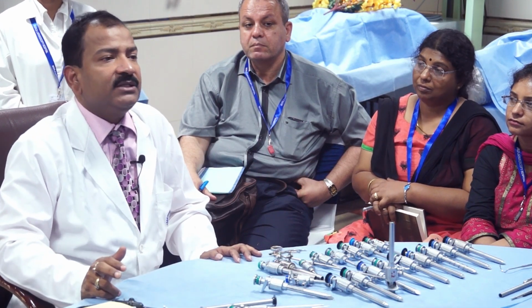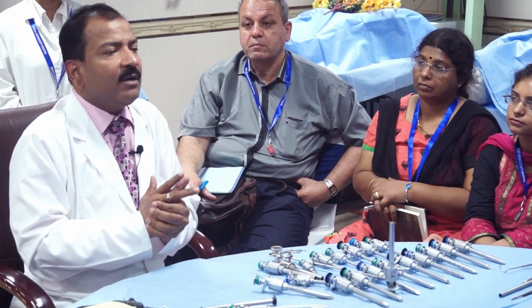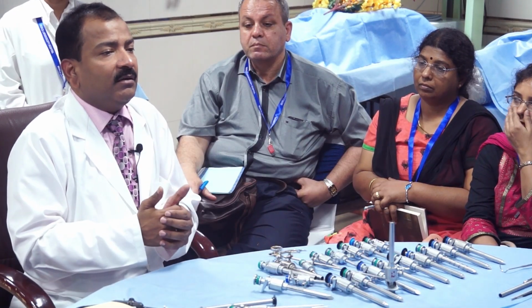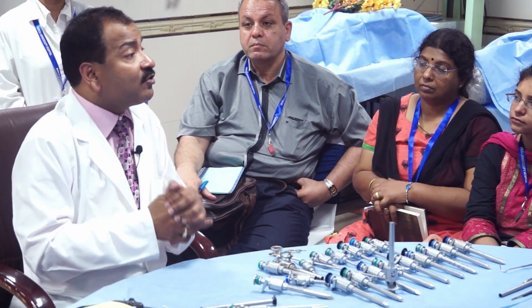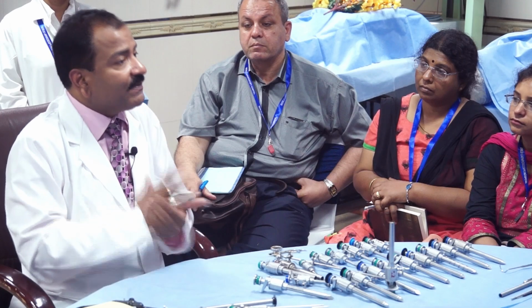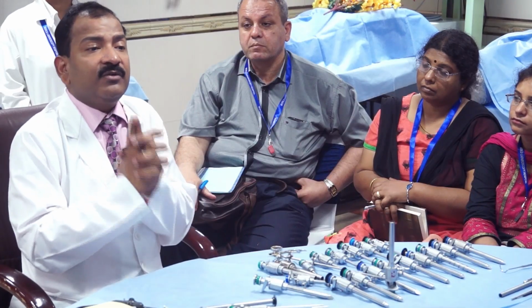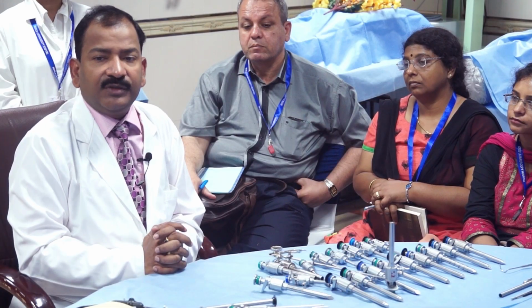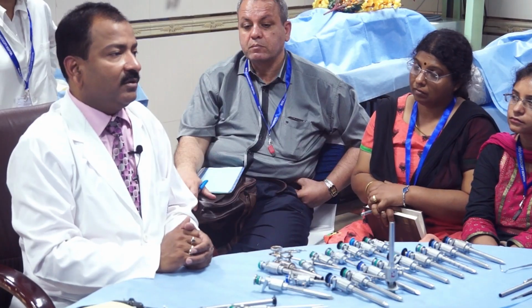Nobody told us. Energy sources: when you are doing monopolar, you have direct coupling, capacitive coupling, insulation failure, and different types of AEM technology, that is, active electrode monitoring system. You have the blend current, fulguration, spray, and desiccation, and which type of current will be used for which tissue, and how much wattage of current it needs, we never know. We think that using energy means burning the tissue.